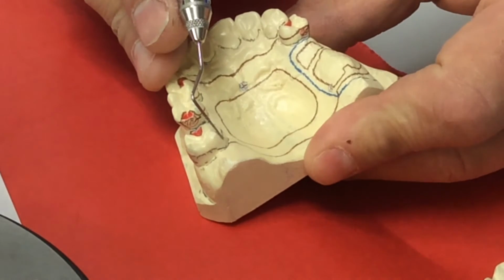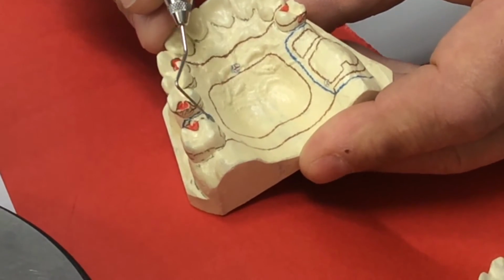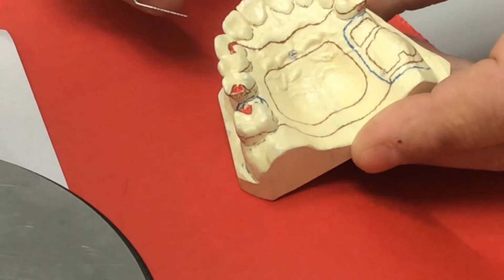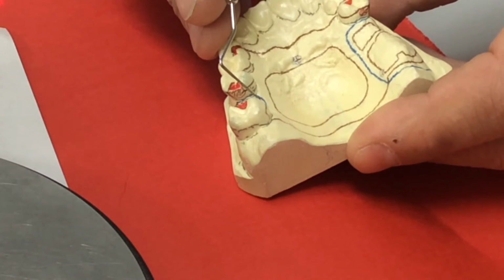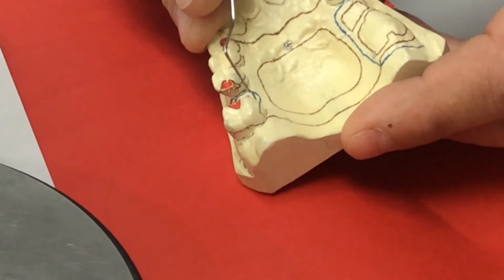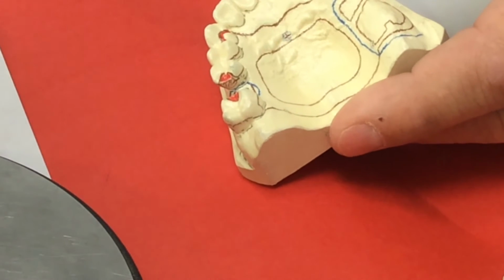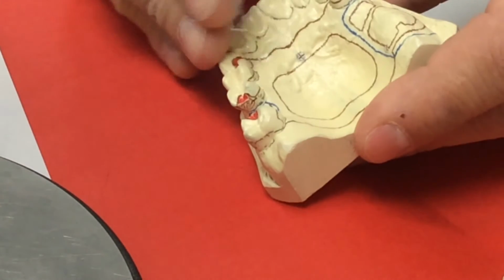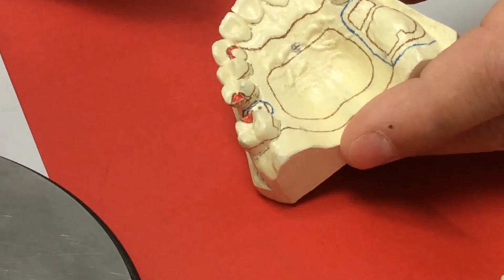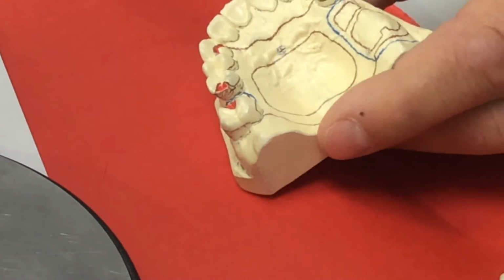cusp. Keep in mind also, the functional cusps for the maxilla are the lingual cusps. So whatever you put here has to be low enough to not interfere with the occlusion. If you give me a lingual plate that comes right up here to the cusp tips because you're trying to get over top of the survey line, it's not acceptable because the patient's never going to be able to bite down. In a case like that, you might have to indicate you wanted to lower your height of contour by doing some enameloplasty. How do we lower a height of contour?